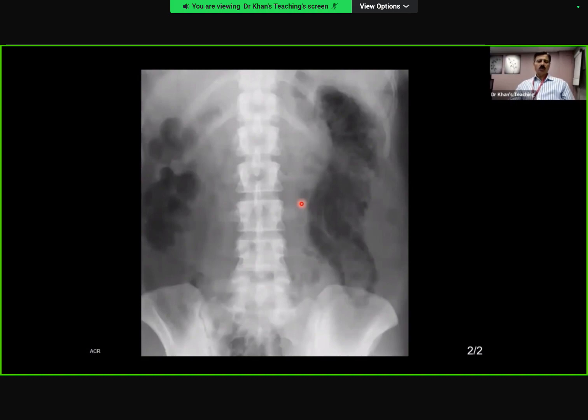So because we knew what it is, nobody acted on it. Basically, you can imagine that these air bubbles can also burst and it can cause free air, but that free air will not cause peritonitis. So you have to know this, and because it's an Aunt Minnie case, it's an important case for the exam.